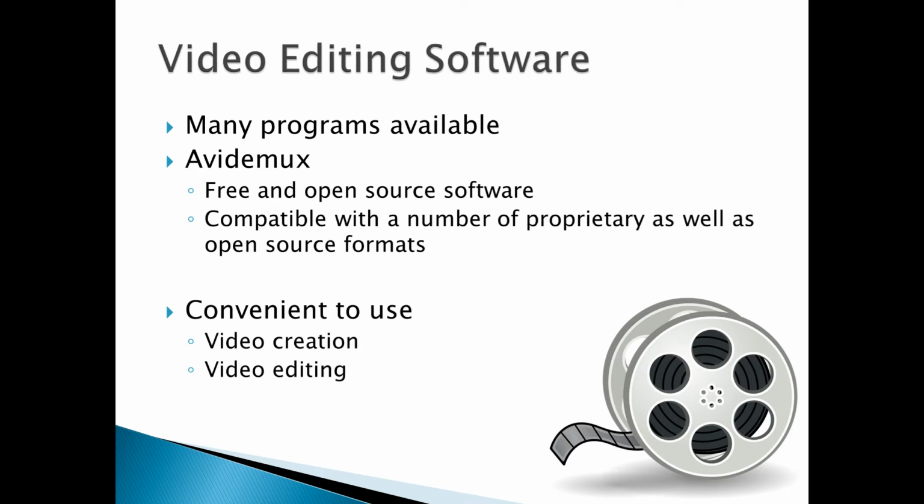So how can we start to use this? It depends on your hospital's IT setup. It is possible to export studies directly as video from some viewing software, but where that's not the case, you have to make it. This isn't as daunting as it sounds. In our institution, the software allows us to export cross-sectional and dynamic imaging as stacks of JPEG images.